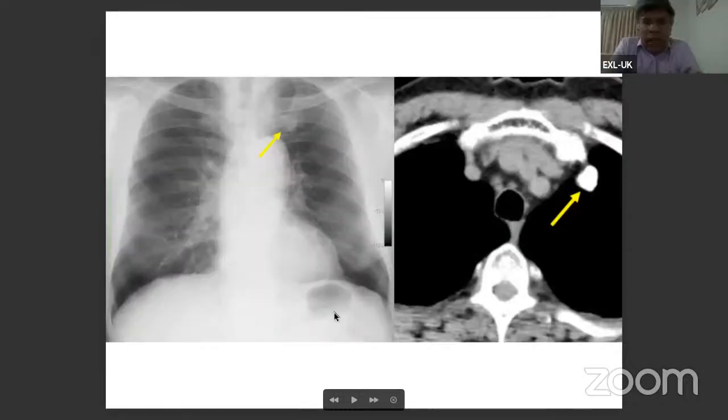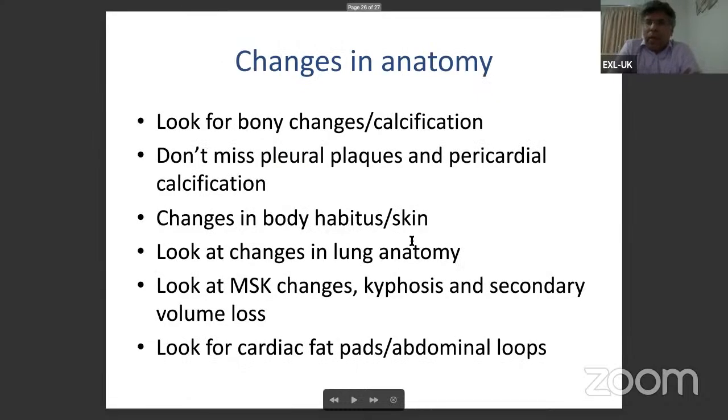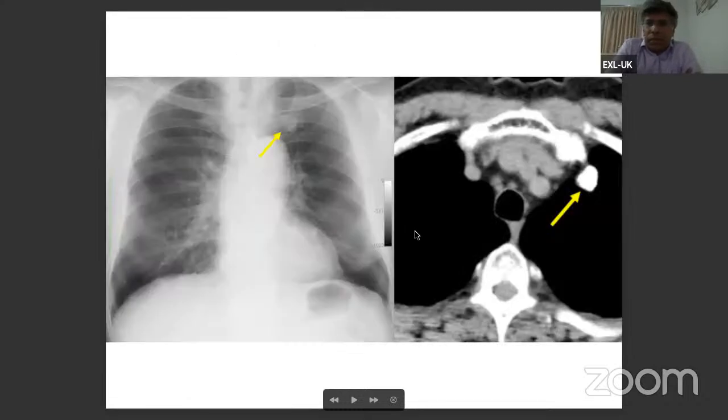The last question, I think, Afsar, I'll let you take this because it was a question about rib fractures, isn't it? Afsar, do you want to discuss that rib fracture there? Sometimes the upper first costochondral junction especially can have a weird appearance. Then people can suspect a mass and can alert the patient that there could be a lesion there, and the CT will show that it is not, there's just a calcified osteochondral junction. So that's one area where people get confused. Always take an opinion before going for the next investigation or telling the patient.